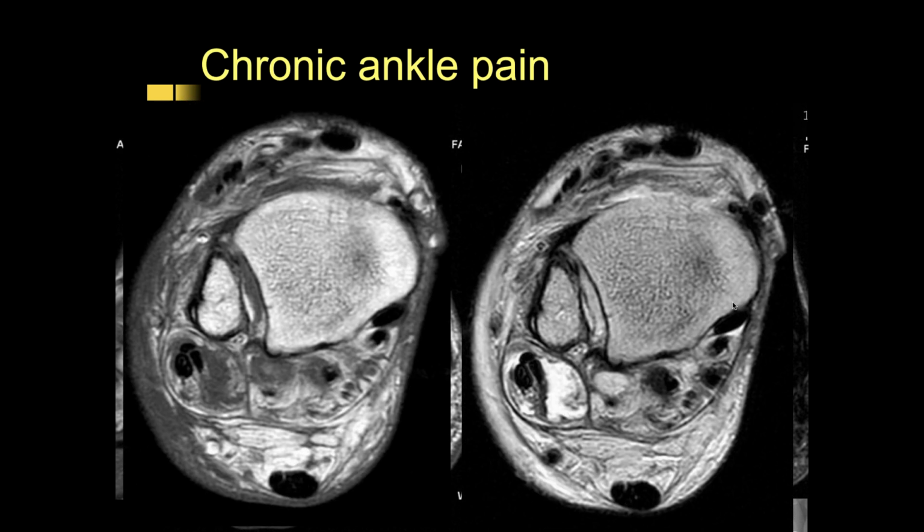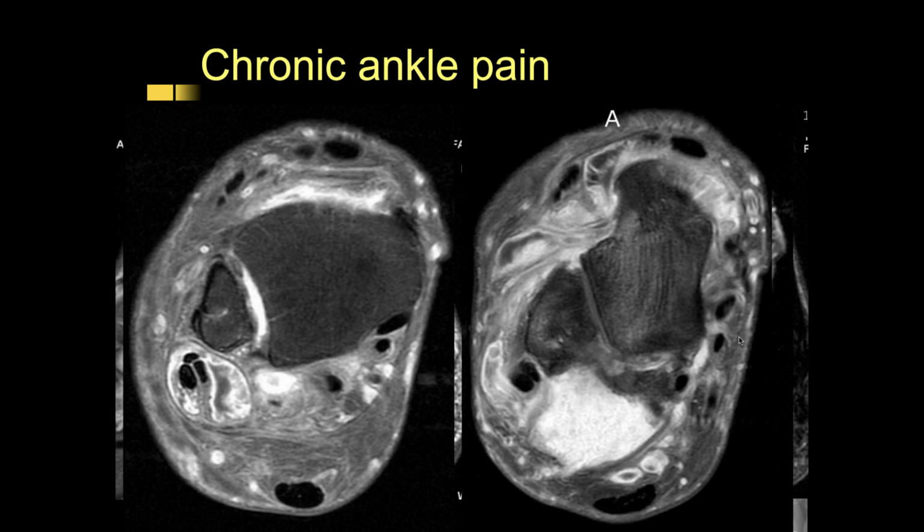Here are the axial images. What do you think of these, Michael? So we have severe tenosynovitis of the peroneal tendons, probably with a split tear of the brevis. There's some fluid, it looks like, in the posterior tibialis tendon as well, so there might be some synovitis. And then, right there posterior to the tibia where you're circling, there's some diffuse pericapsular joint synovial thickening, and then some edema involving the extensors as well. So there's diffuse tenosynovitis affecting multiple tendons. Yeah.